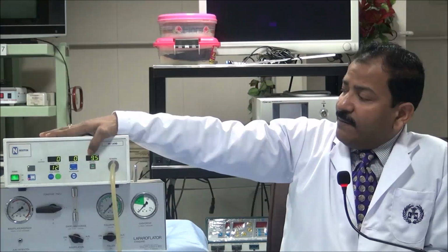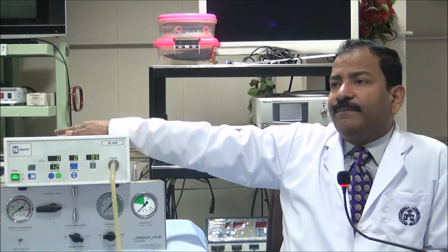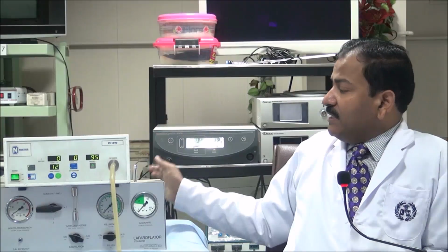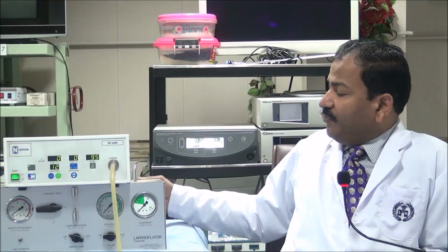Another important thing: when you use a cylinder, don't keep the cylinder lying down. Always keep the cylinder erect, because if you put it in a lying down position, liquid CO2 enters. When you buy an insufflator, they give you a cylinder.